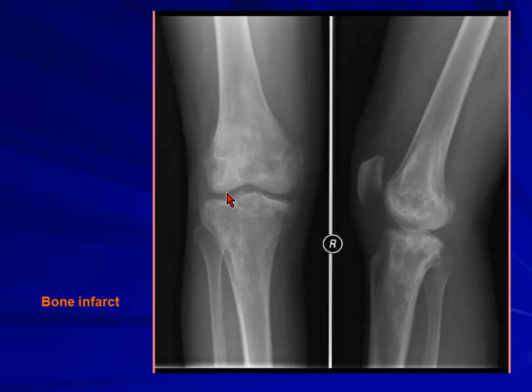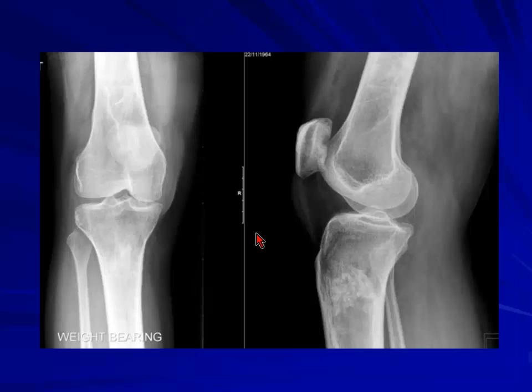Normally it doesn't destroy the articular surface. It's within the marrow and it becomes an infarct. People with sickle cell and steroids are prone, and probably chronic renal failure. So this is a typical picture. If you see this, and if you see abnormal uptake on bone scan, as Gopi showed in the last presentations, the pattern and distribution is likely to be infarct.